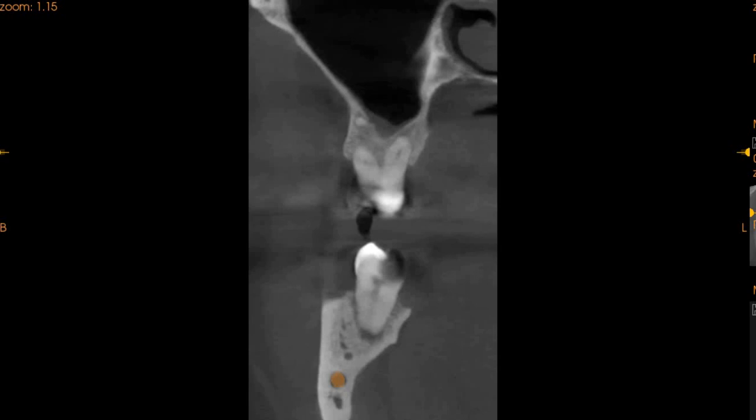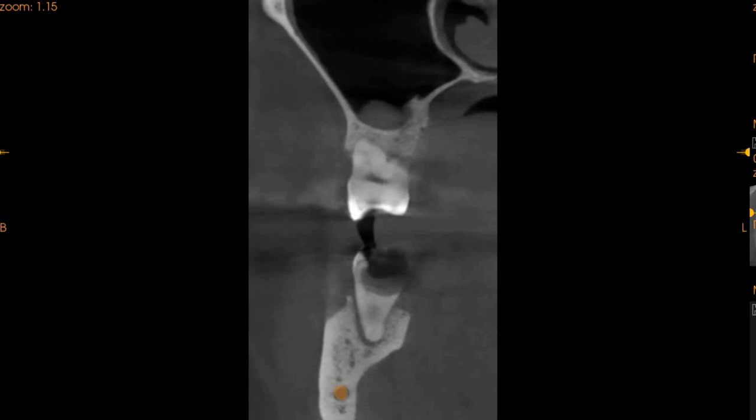On the bottom right third molar, we can see it is also grossly carious with major periapical radiolucencies, and the furcation area is also very close to involvement here. You can see that there is significant bone loss. We've got PDL widening as well.